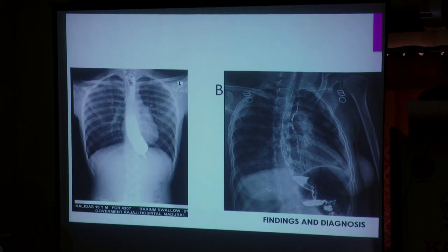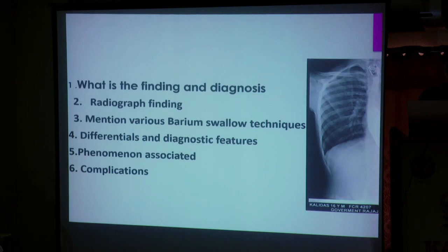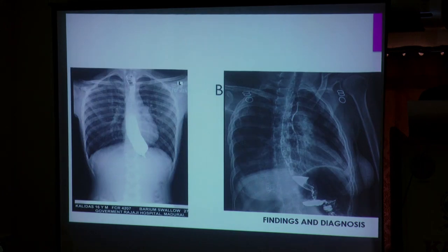Next I will be showing 4 sets of barium images. You can even be asked about the swallow techniques. Okay, so I placed these 4 cases. For the first 2 cases, the common finding is esophageal dilatation.